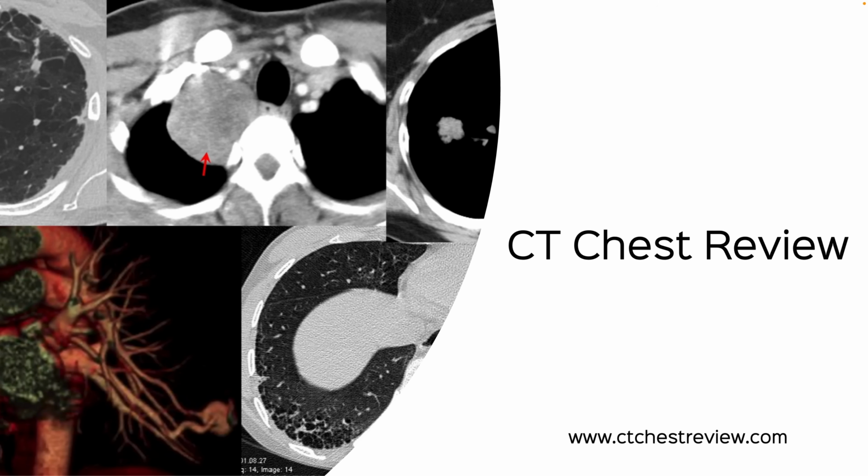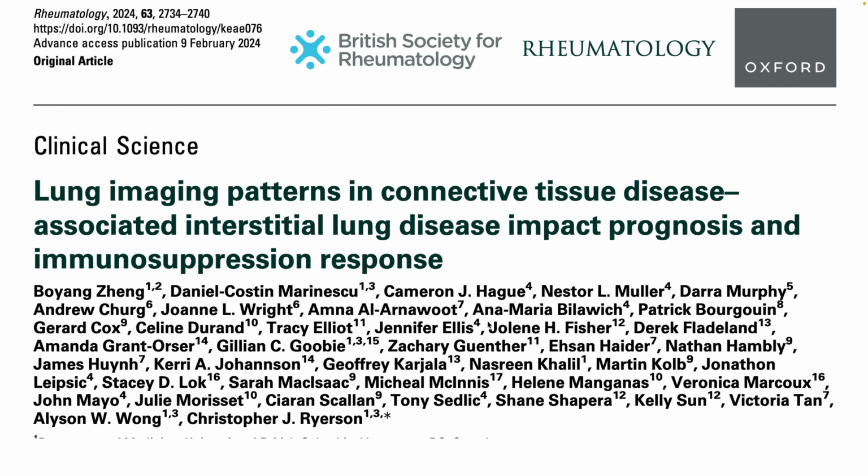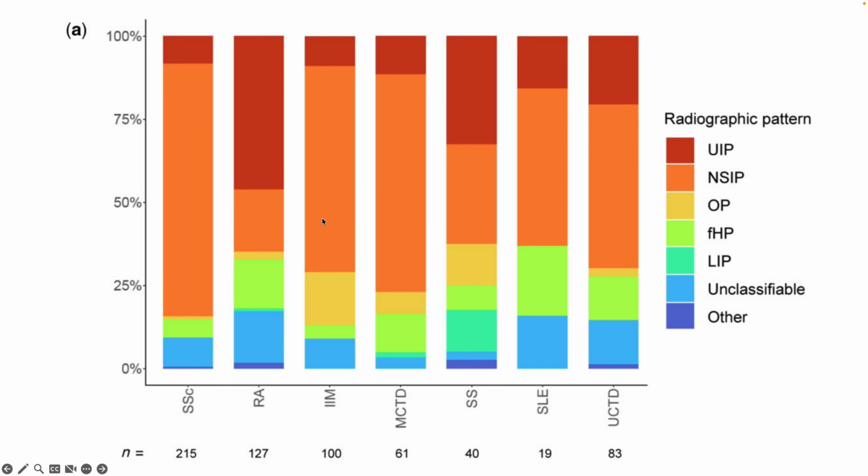Hi, welcome to CT Chest Review, and today we're doing the 28th snippet, just discussing the various connective tissue disease ILD patterns. A lot of our recent understanding comes from this paper from Chris Ryerson's group, where they looked at a bunch of CTDs and the patterns here.